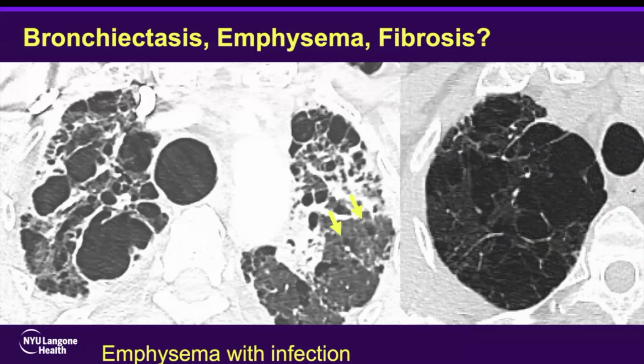So this is a pitfall when patients have underlying emphysema. And comparison with old films, of course, is most helpful, but if there are no old films, a short-term follow-up can help elucidate as needed.